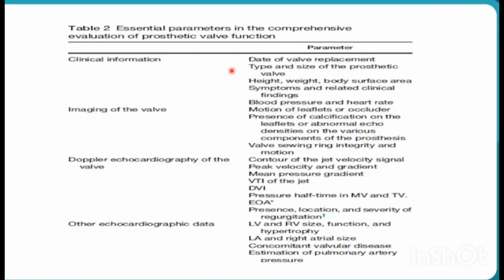If it is an aortic annulus, whether the sewing ring has got detached from the annulus, and whether there is a loss of integrity between them. Those aspects can be evaluated just by using the screening and not the Doppler parameters.